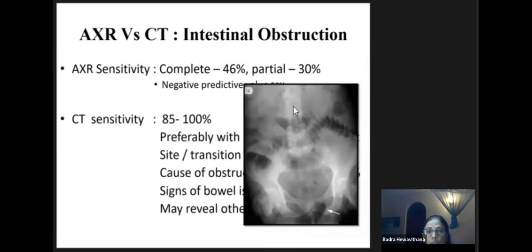This one you can see, this is abdominal X-ray. Intestinal obstruction is very well seen. The small bowel loops are dilated. You see the valvulae conniventes, central loops, multiple loops, all these things are there. So, this patient was from our hospital when I was working.